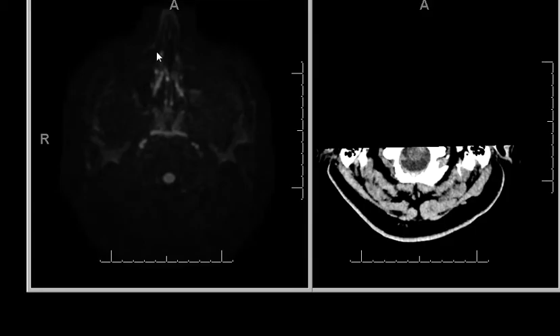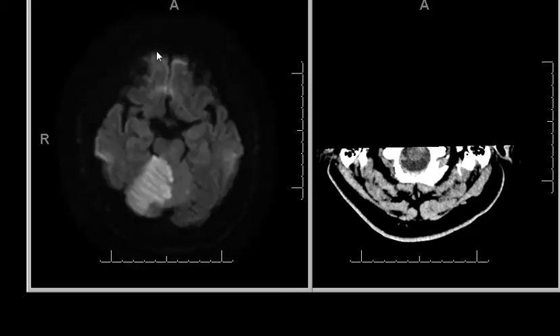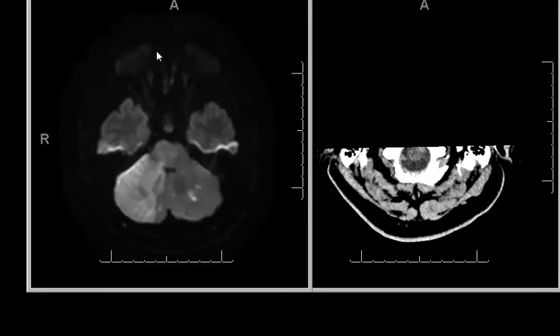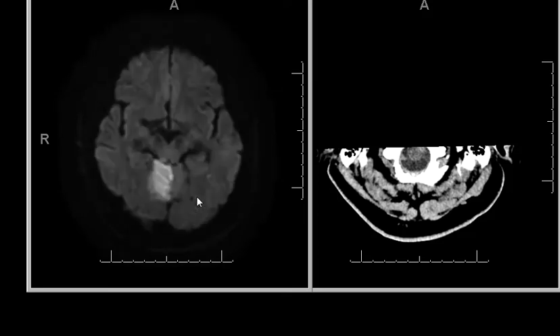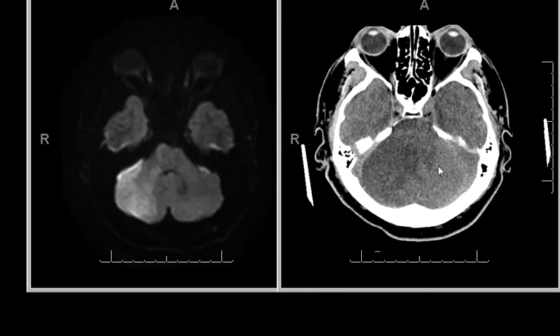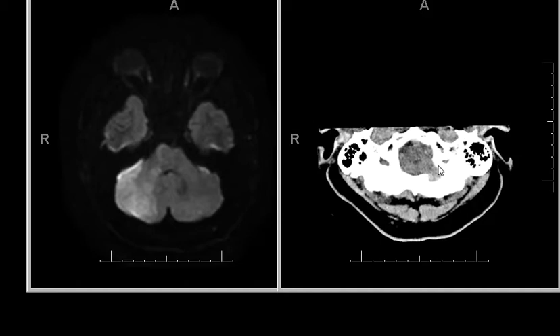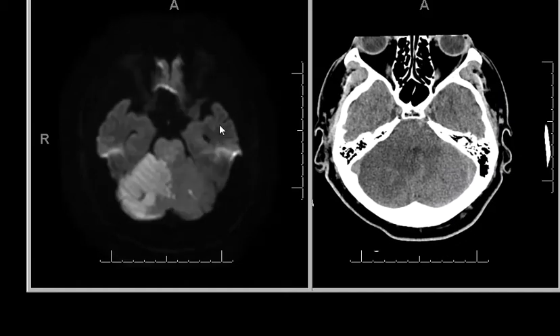However, the MRI study obtained on the same day after the intervention still showed a large area of middle and superior right cerebellar stroke, and also scattered areas of left-sided cerebellar stroke. The next day CT showed more blossoming of the posterior fossa stroke.